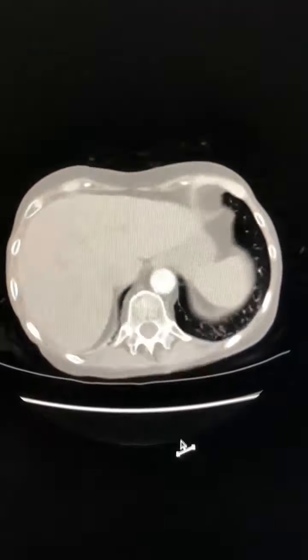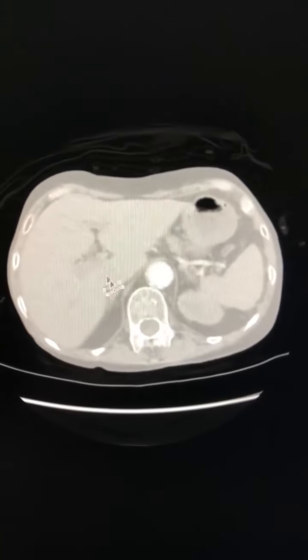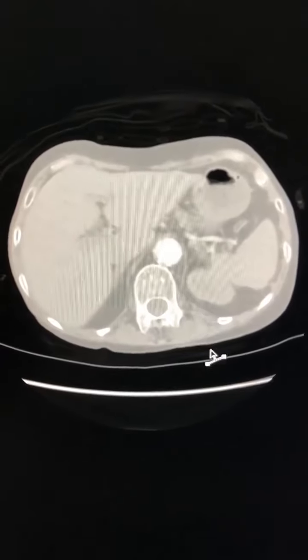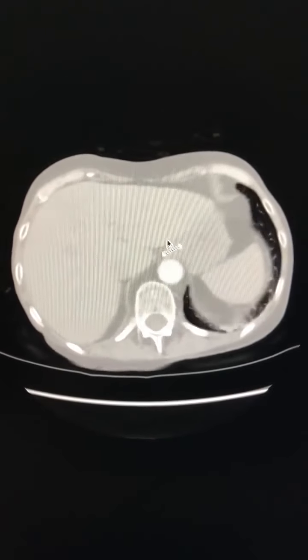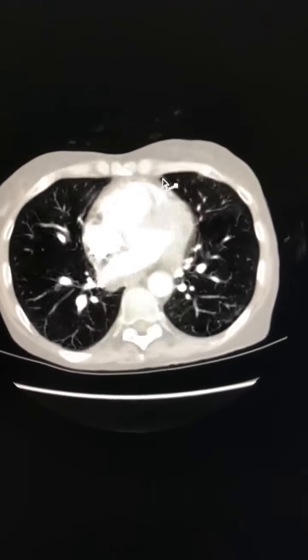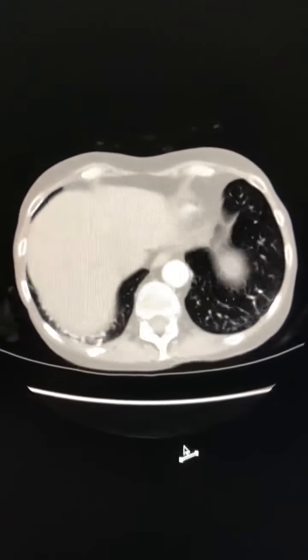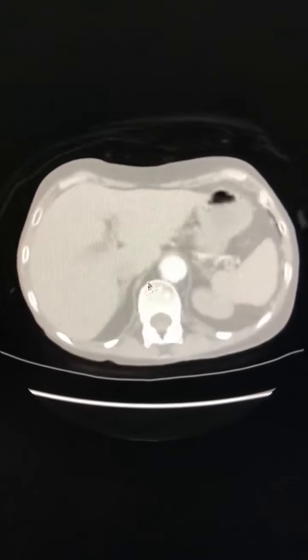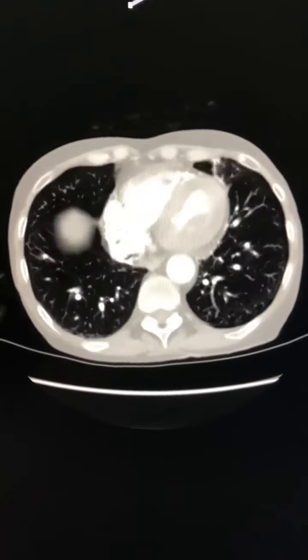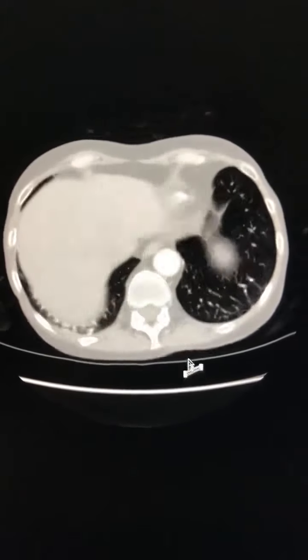We will go further down to the liver and IVC, and we do not see any contrast here. It again means there is no regurgitation through the tricuspid valve, means there is no right heart strain. So to repeat it again, to see right heart strain, we have to see three things: diameter of pulmonary trunk, IV septum bowing, and regurgitation of contrast in IVC. So in this case there is no right heart strain. So we have ruled out PE, we have ruled out any right heart strain.